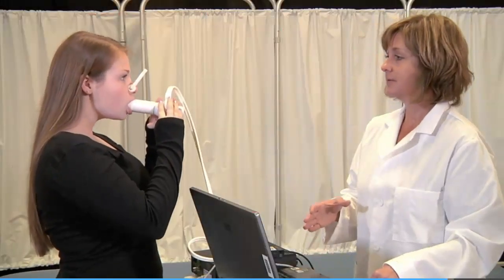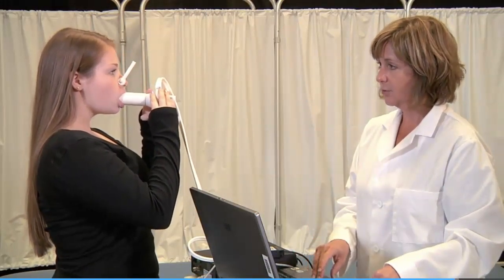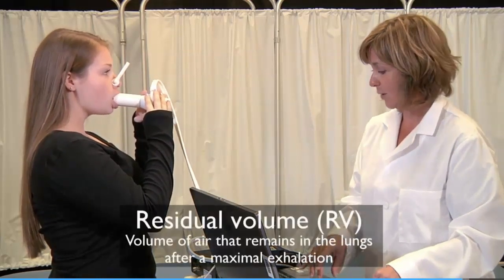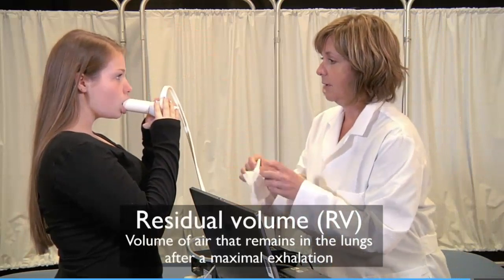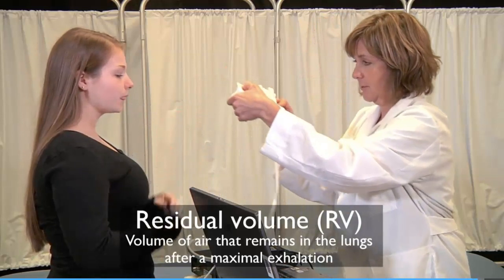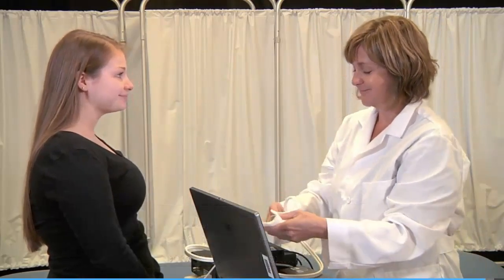Even after we exhale all the air we can, our lungs aren't empty. There is still a volume of air that remains in the lungs, called the residual volume. The residual volume can't be measured with a spirometer. It is a calculation based on sex, height, and age. It's typically about 1,200 milliliters.